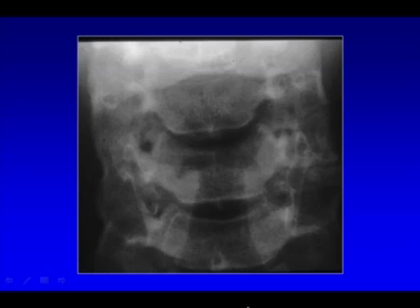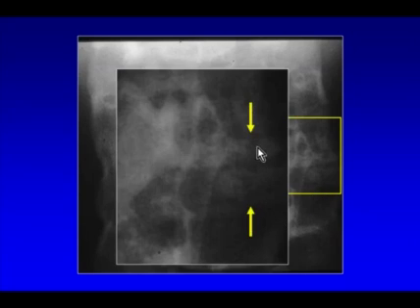We went and got a radiograph. And when we magnified this area, we saw that there was a pseudoarthrosis between the lateral elements of the cervical spine that was protruding out and causing the palpable abnormality. So ultrasound, by being able to correlate the palpable abnormality with the ultrasound findings, can detect not only soft tissue masses, but even bony prominences as well.